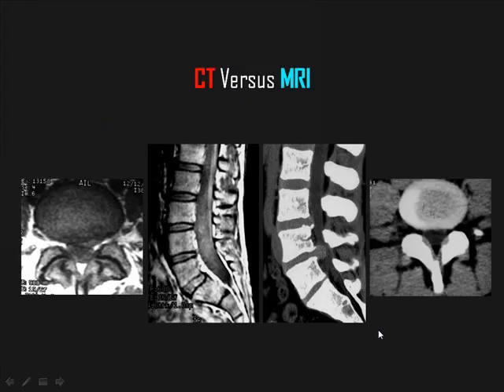Okay. Then the newer CT machines, as I just told you, can produce these sagittal reconstructed images. How can you discriminate between the CT image in the sagittal plane and the MRI? It's easy for the radiologist and also for the clinicians. Just look at the vertebral end plate. The vertebral end plate is black in all MR images. The vertebral end plate is dense in all CT images.